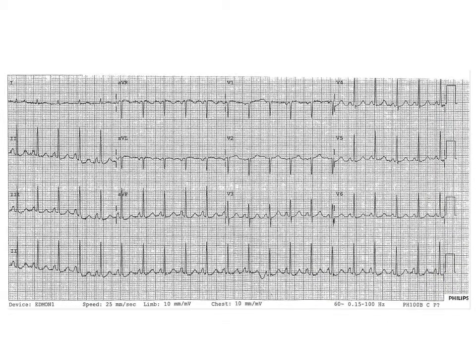All right, some extra EKGs just for fun. Rhythm strip bottom, lead 2, regular or irregular? It is regular. Do you have P waves before each one? Yes. Rate is what? Roughly 3 big boxes in between the R waves. 300 divided by 3 is 100. It is sinus, it is regular, and it's tachy, sinus tachycardia.